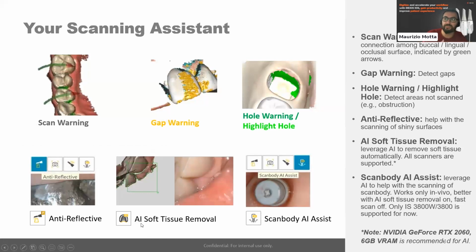Regarding the scanning assist, this was already spoken about in the previous webinar, but I want to focus on this because the software includes more than one scanning assist. The first three are actually warnings or advice from the software itself about the quality of your scan.